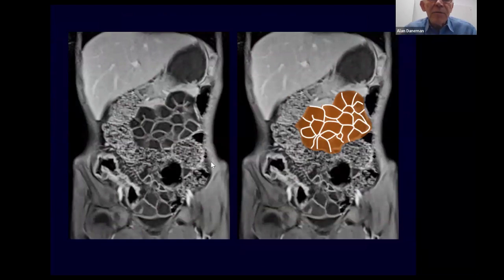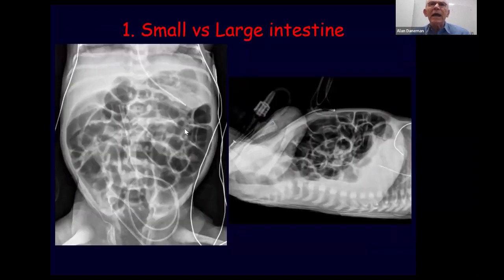If you look at other modalities, sometimes even on an MR, you will see the small bowel like this. If you look carefully enough, you'll see the giraffe in there, just like I tend to see a giraffe pattern. So I like to use that as a way of explaining what the bowel should look like. When it gets obstructed or there's ischemia, you lose the polygon pattern, as I'll show you, and the loops look a lot more rounded and elongated.